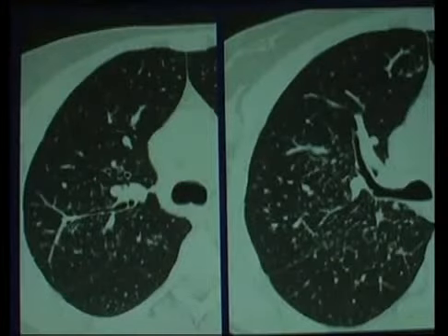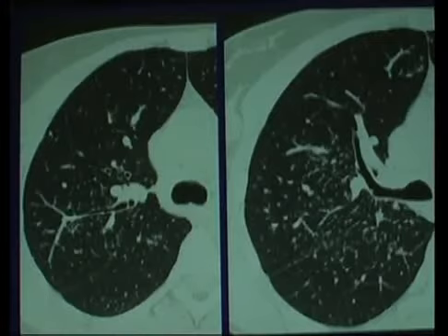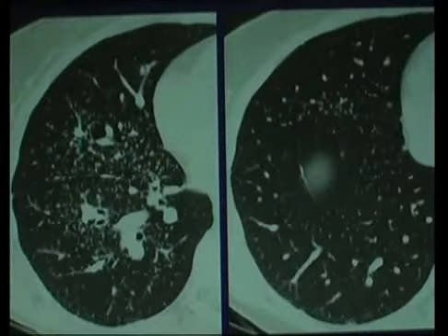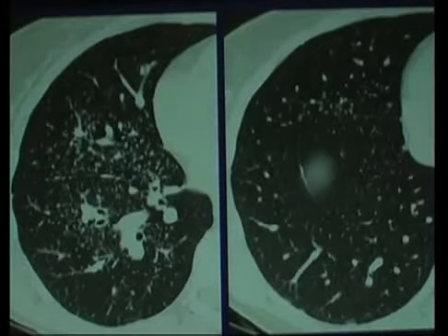So just more examples of the same. Lots of nodules. Again, you have to make a judgment that you're dealing with nodular disease. This particular case, along the fissure, maybe not so compellingly along the pleural surfaces, but along the airways, along the vessels again, clearly someone who has this pattern of distribution is perilymphatic. These things can cluster into almost a sandstorm. And again, the distribution tells you along the pleural fissure here, again, clustered along vessels and so forth along here.